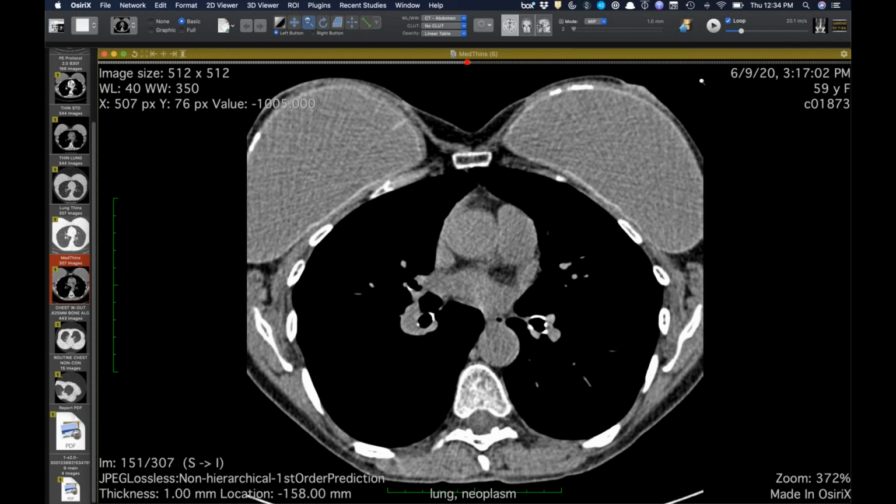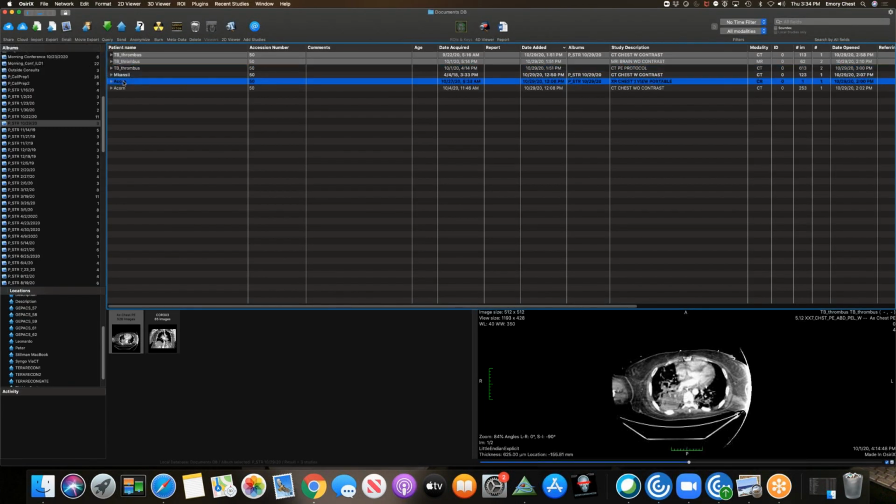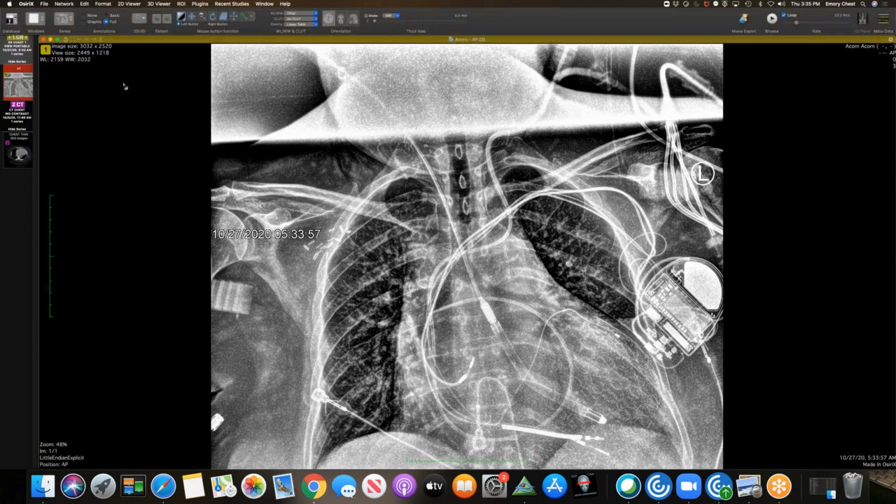What's that, Howard? Sorry, you thought they were maybe increasing slightly in size over time? Yeah, they've definitely grown slowly since 2009, that first study I showed. So that'd be doubling time on the order of years. Yeah. So sarcoidosis is good, but I'm thinking of other things that produce nodules that can grow slowly over time. One is the entity of pulmonary hyalinizing granuloma. And if something grows slowly but faster than this with nodules in the female, I would think of pulmonary epithelioid hemangioendothelioma.